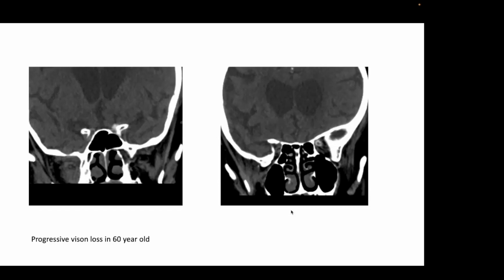Is it optic nerve thrombosis? Well, let's start. What's the finding? Some hyperdensity around the left optic nerve. Yes, exactly. Hyperdensity should be the hemorrhage. Okay, so hemorrhage or what else?